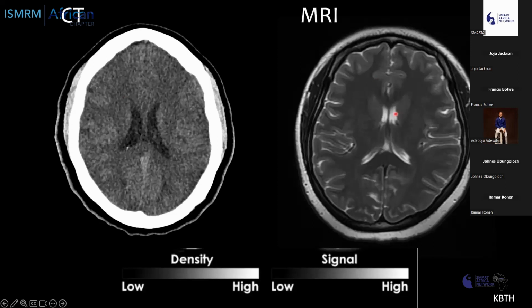the body of the lateral ventricles. So the midline structure here, we see some white signal within the lateral ventricles, which connotes the CSF within this space. So we'll say a hyperintense signal of the CSF within the lateral ventricles. Then once we move to the periphery, we appreciate the dark white matter, right, compared to the gray matter at the periphery of the cortex, right?